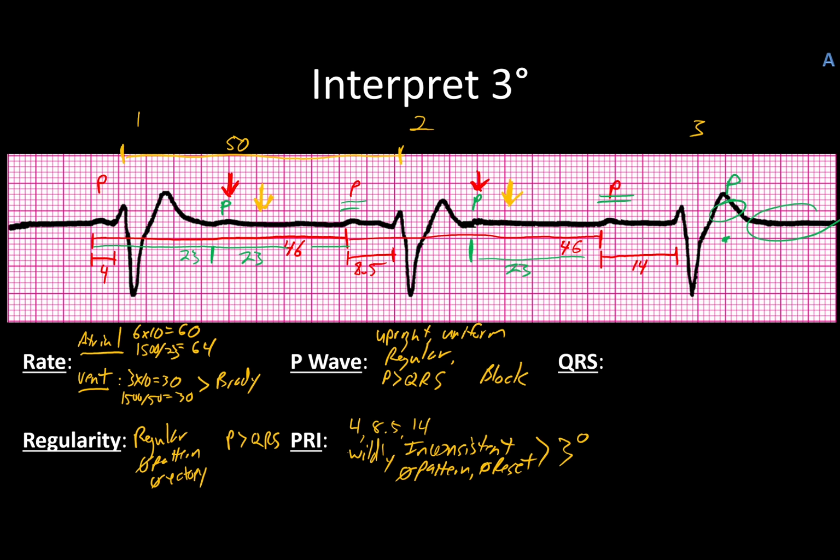Well, I'm actually going to go vertical for these, and I'll do this in blue so you can see them a bit better. And we'll go from right here. And when we're measuring these, because you see how the S wave actually takes a bit of a break, it stops and then turns, so that you've got your tip of the S wave down here, but then it comes up and it shifts directions. That's actually what we can use, at that spot, because that's the J point, which is just about a half box in.